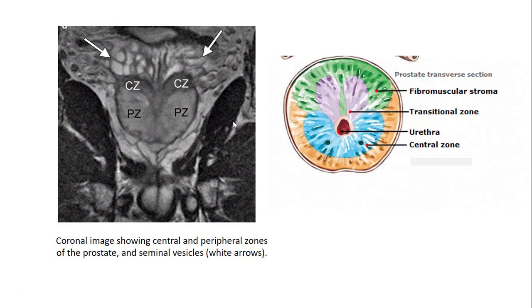On some of these MRI scans, I didn't mention it before, but some of them will not use an endorectal coil. And I think on the next one where I show you images of some cancer areas in the prostate, they probably will not be using the endorectal coil. As the MRI scans have gotten a little bit more advanced and they use a stronger magnetic field, so a 3 Tesla rather than the 1.5, they are often able to get really good images of the prostate without using the higher signal coil right next to the prostate that they used to have to use.